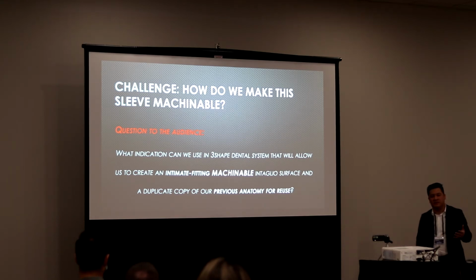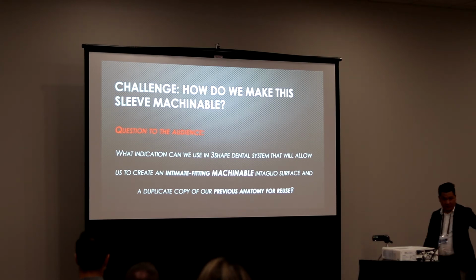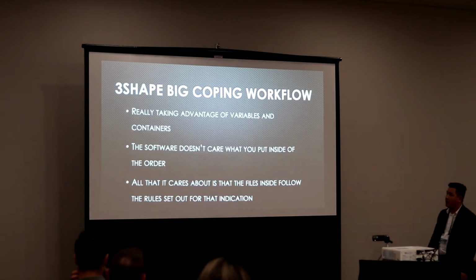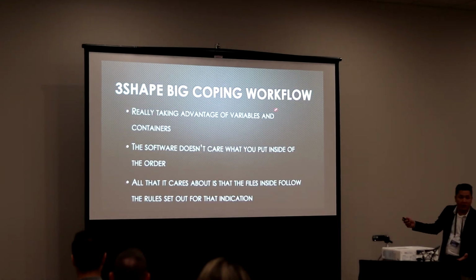You're right, actually. One of my first inclinations when I tried to experiment with this was to use tabletops. But the problem with tabletops is it doesn't allow you to select the whole bar. It has a kind of volume limitation. But very much, yeah. The first indication that was ever available in 3Shape was the coping indication. So what I call this is the 3Shape big coping workflow.